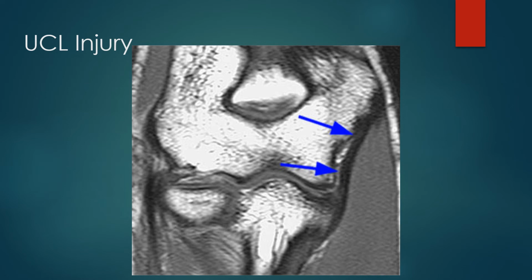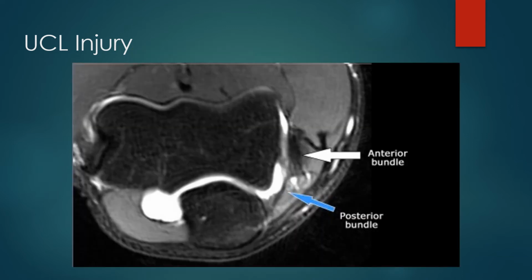This is a T1 weighted MRI of an 18-year-old professional baseball pitcher. The blue arrows help to trace the UCL, which has been thickened, and that's likely due to repetitive stress during pitching. However, there is no focal abnormality that might indicate a tear of the UCL. So we can simply follow the blue arrows down, and we can trace out that UCL now that it's been thickened and is a little bit easier to see all in one slice.